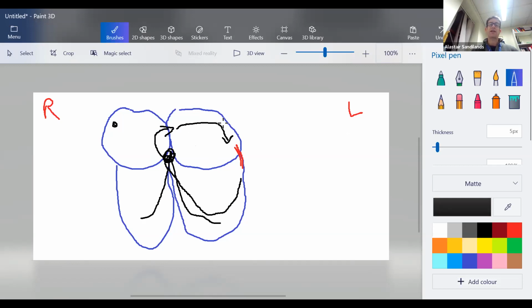This is a fast, regular tachycardia. Every beat has a delta wave, because the conduction is going forwards over the pathway from the atrium to the ventricles, and going round, re-entering again. This is antidromic tachycardia.